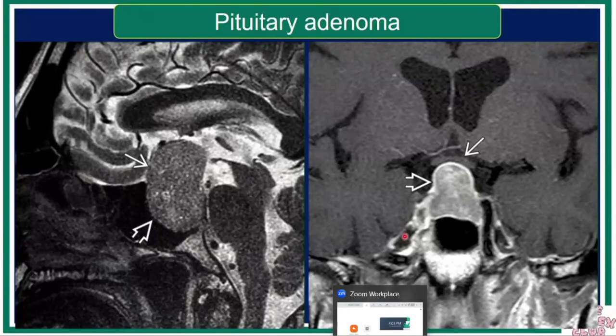Yeah, I think there is an argument for moving even away from dynamic imaging because a lot of people say that dynamic imaging is not that useful with the use of thin slice imaging, for example, VIBE or other 3D SPGR sequences that are T1-weighted sequences designed to obtain very thin slices. Even in the literature, people say there is probably not a big use of doing dynamic contrast sequences because 3D SPGR or VIBE are much more sensitive at detecting smaller adenomas compared to the normal sequences.